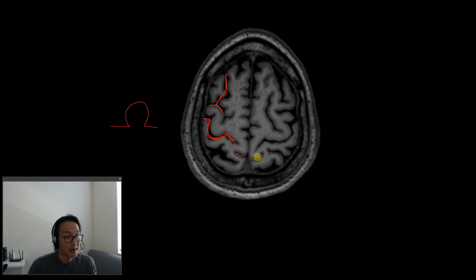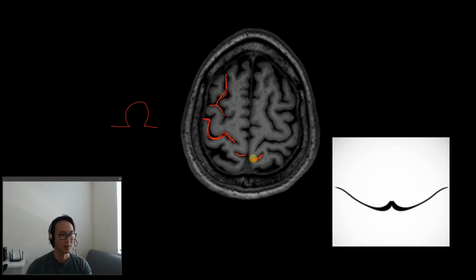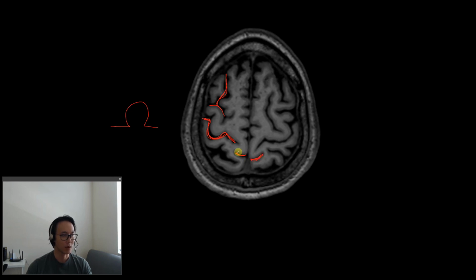The bracket sign represents the pars marginalis of the cingulate sulcus, also known as the marginal sulcus. And I talk more about that sulcus in another video. Every time that I look at that sulcus, I think it looks like a mustache, so maybe we could call that a mustache sign as well. The only problem with that is that there are some authors that describe the central sulcus morphology as a mustache, but I think that the bracket sign is more similar to a mustache, and obviously it depends on the style of the mustache.